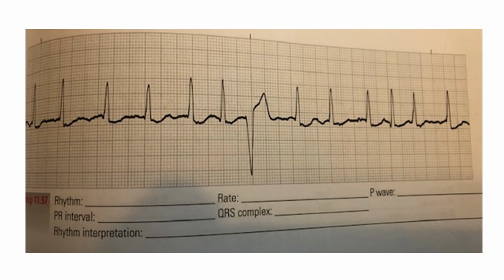So your QRSs are 0.06 to 0.08. So we do have one premature beat. Your premature beat, it is wide. You could definitely tell it doesn't have a P because the patient's in AFib. However, because it's wide, we know that it is a PVC. Usually you don't count a PAC or PJC when somebody's in atrial fib because their rhythm is erratic. And usually patients will have oftentimes frequent PACs right before they go into atrial flutter or atrial fib.